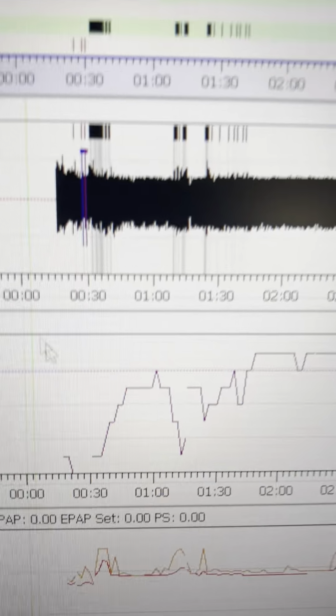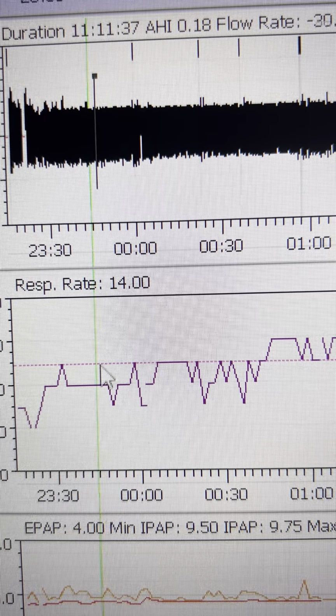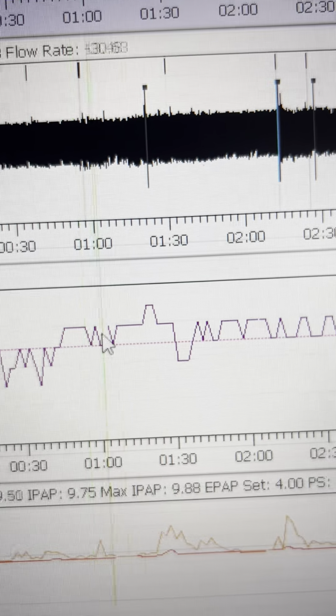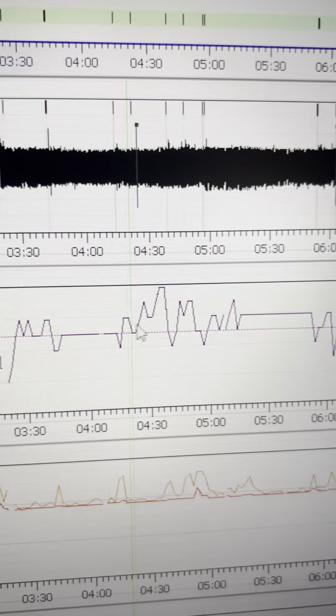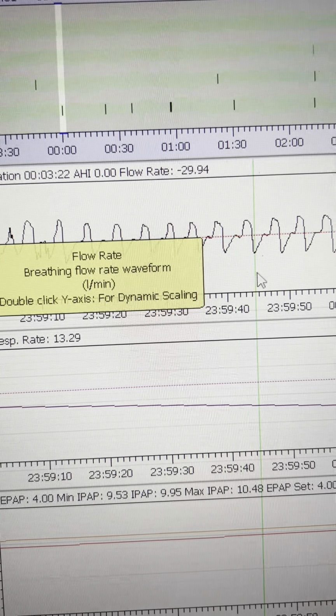If your normal breathing right here, so the respiratory rate is just 2 under this line and 2 above, then you're probably in the right titration range for checking what's actually obstructing and stuff. Because here you can see things more clearly, and I don't think I had any of those weird breaths anymore.